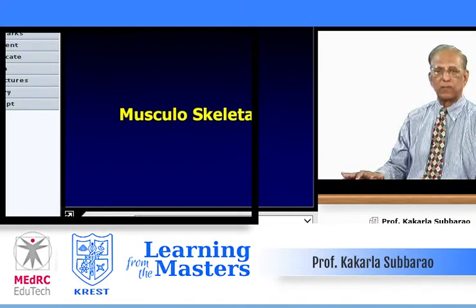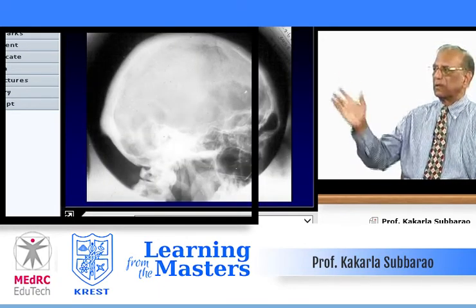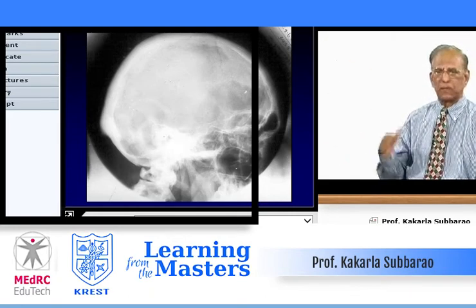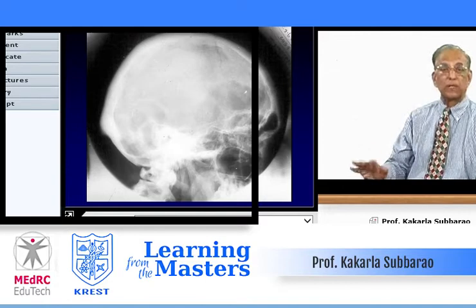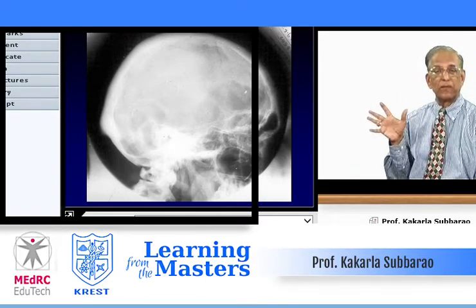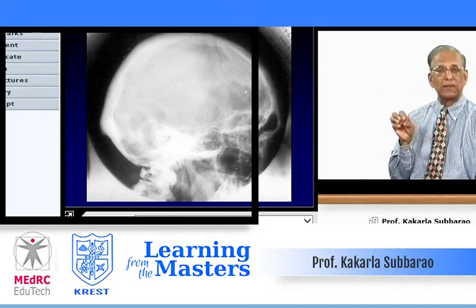And then what are the emergencies in the musculoskeletal region? Already we mentioned fractures. Head injury, look at the orbital plate, linear lucency, head injury. A simple lateral view of the skull or AP view of the skull is good enough. Not that the fracture itself is dangerous. The important thing is the contents of the skull, the brain. Is there injury to the meninges? Is there injury to the brain?